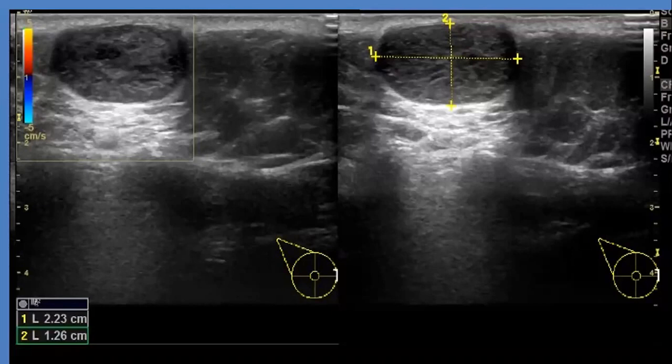Which one arises from which? We'll go through that for a while. But what do you suspect for these lesions? Is it a hypodermal or dermal lesion? Then we'll go for the differences. What do you suspect? Dermal or hypodermal origin?